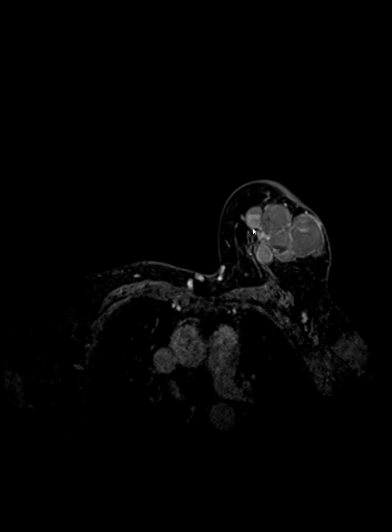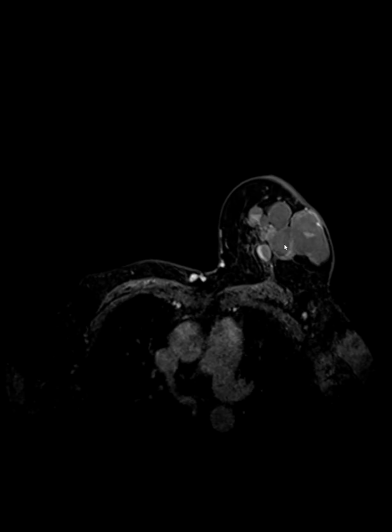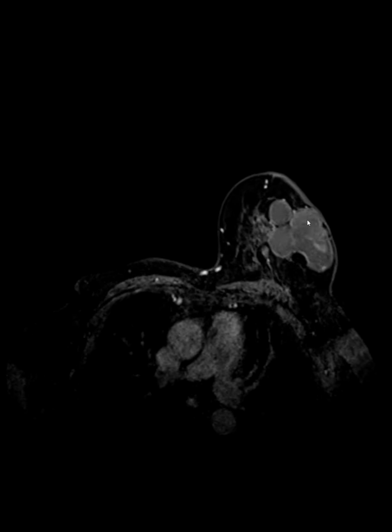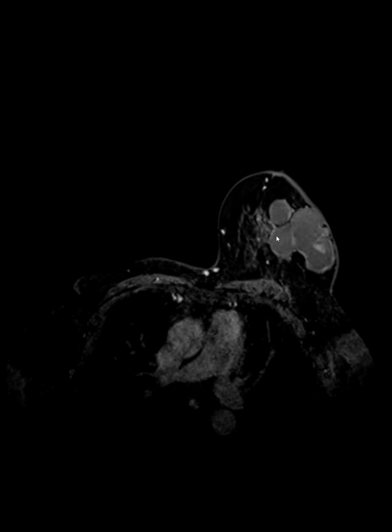As we move on to the dynamic post-contrast images, you can clearly see that the cystic components with the fluid levels do not appear to demonstrate any sort of post-gadolinium enhancement, but there is an ill-defined solid component associated with this cystic multiloculated lesion. All these features extend up to the skin with some amount of asymmetric skin thickening of the breast and a solid early arterial enhancing solid component.